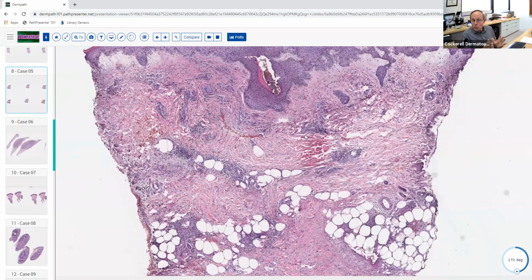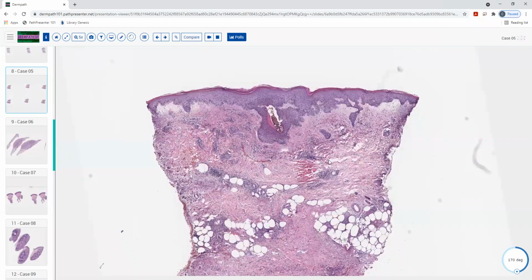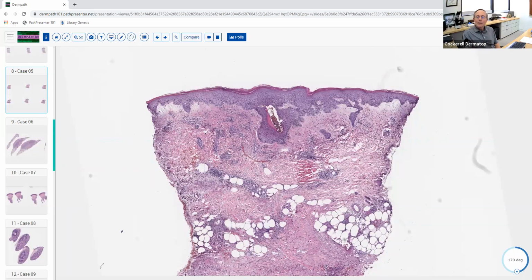Now, it's got neutrophils predominating in the infiltrate, but why is this not Sweet's disease? How come it's not Sweet's? I'm assuming because it's not as confluent. Maybe it's more diffuse, not as organized. Yeah, that's partly correct, but also in Sweet's you get a very dense, diffuse infiltrate, usually up in this area, of just a sea of neutrophils. You get tons of polys filling this area, and you get papillary dermal edema with Sweet's also, so it can look edematous, and it actually sometimes can lead to bullous lesions.